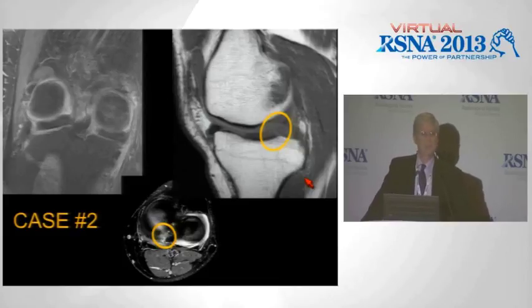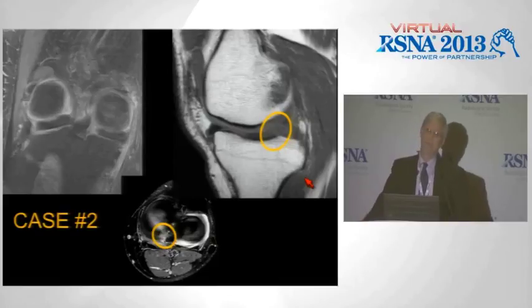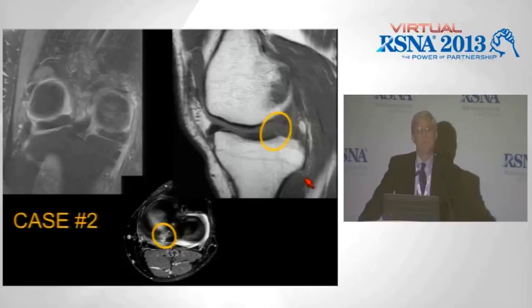Now, the reason these tears are important is because they make the meniscus more mobile. And these tears can have implications, and some of these patients will rapidly develop degenerative disease. Now, while there are multiple surgical techniques, newer ones being developed to try to address this with an anterior portal, the posterior portal may have to be done to address this kind of tear.